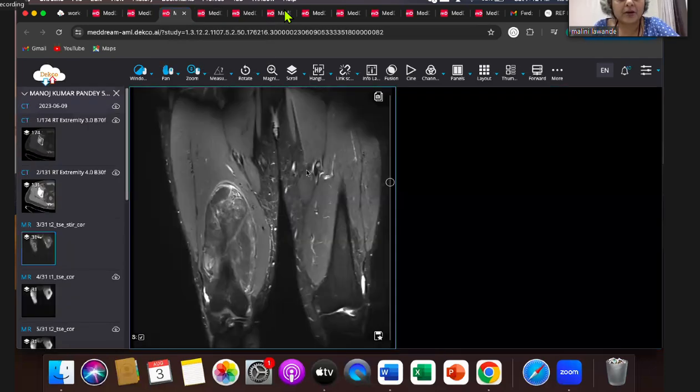Okay. So nerve sheath tumors of spine. Nerve sheath tumors of spine can be epidural. They can be intradural, extramedullary, and epidural, both, a dumbbell shaped, which is going from the intradural compartment outside into epidural, then into the foramen, into the adjoining nerve root. So they can have that typical scalloping of the adjoining bone. Again, they can have central target-like appearance or not. So when you have an intradural extramedullary lesion in the spine, the two main diagnoses are going to be meningioma and nerve sheath tumor.